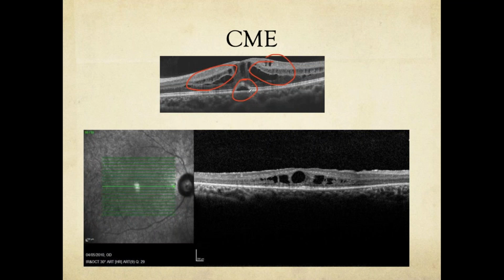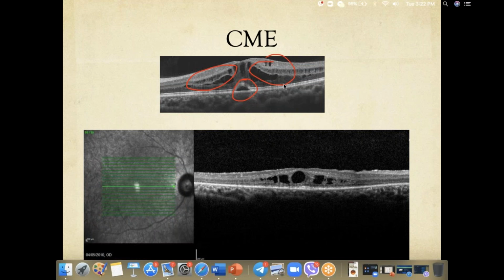What do you think it is? Okay, we'll come back to this slide again.